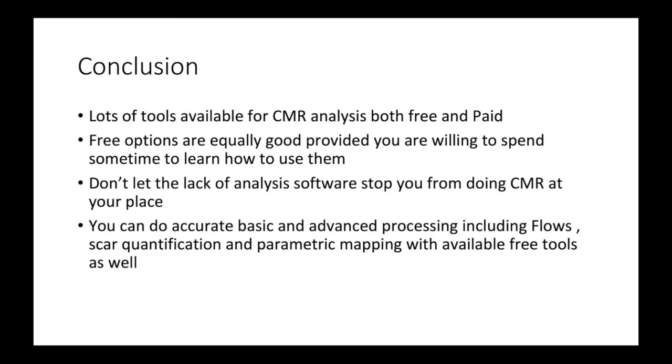You can also do accurate basic as well as advanced processing, including Q flows, scar quantification, and parametric mapping with these available tools as well.